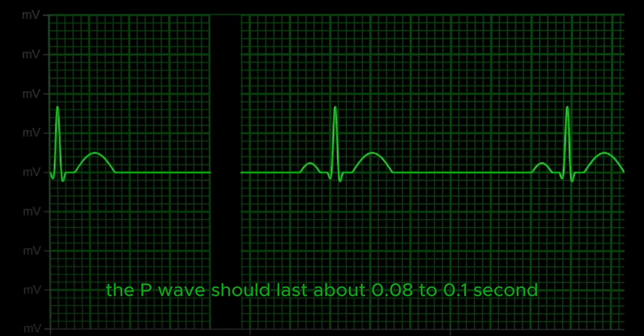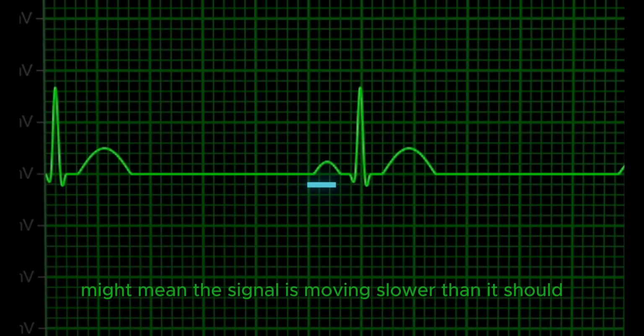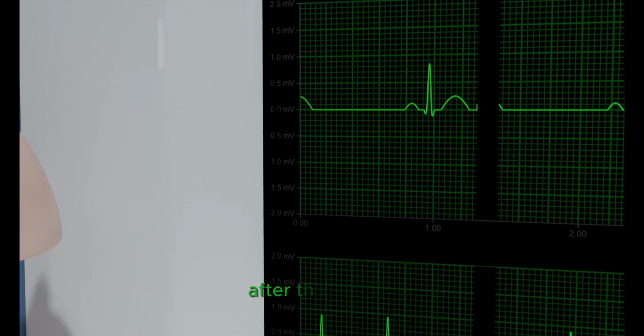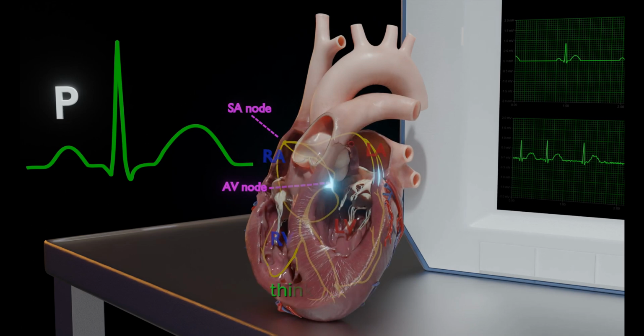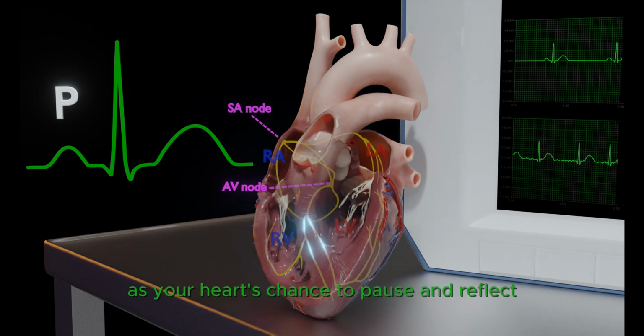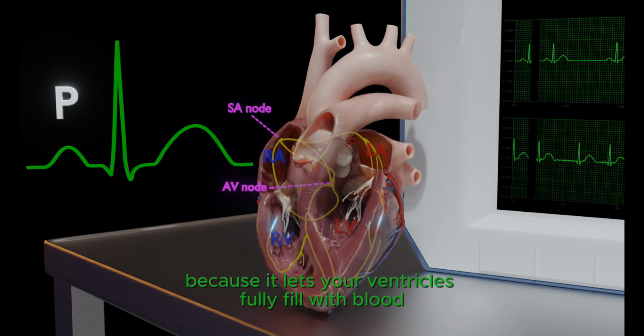Normally, the P wave should last about 0.08 to 0.1 second. Any longer might mean the signal is moving slower than it should. After the P wave, the electrical impulse pauses briefly at the AV node. Think of this as your heart's chance to pause and reflect. This pause is crucial because it lets your ventricles fully fill with blood.